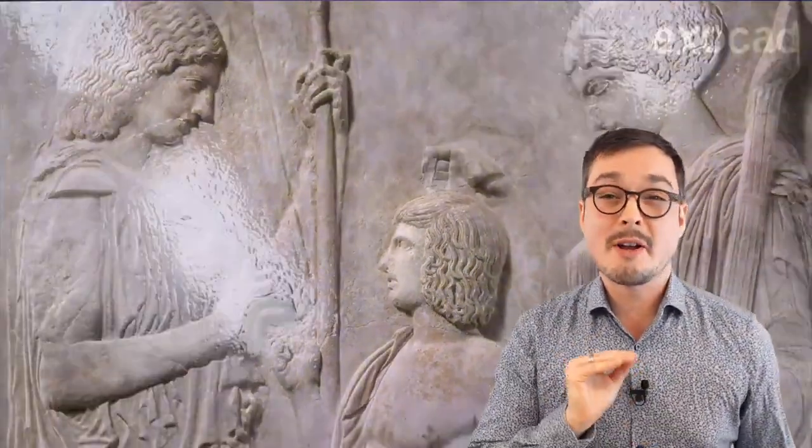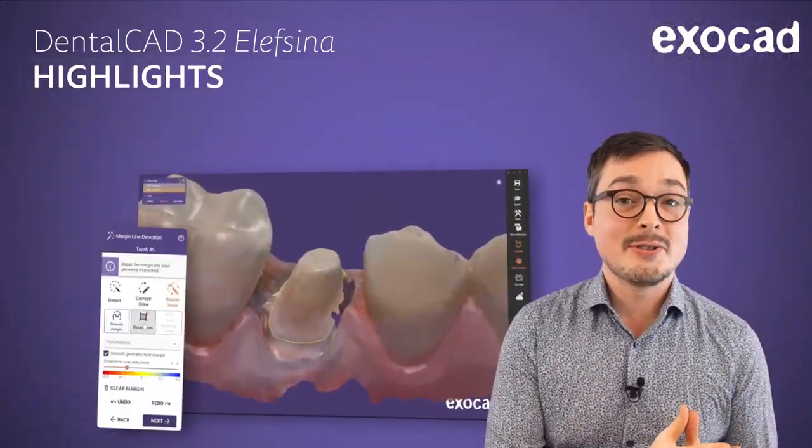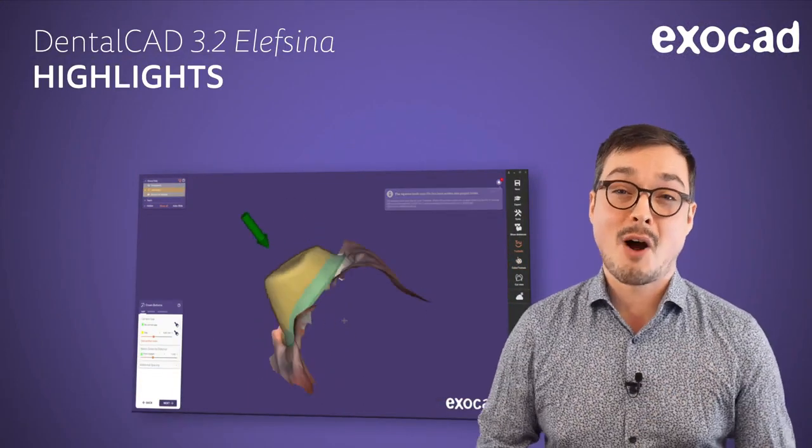Get ready for the next evolution in design. In this video, we are proud to present to you the highlights of DentalCAD 3.2 Elefsina, like the margin repair tool that allows you to make the most of imperfect intraoral scans.